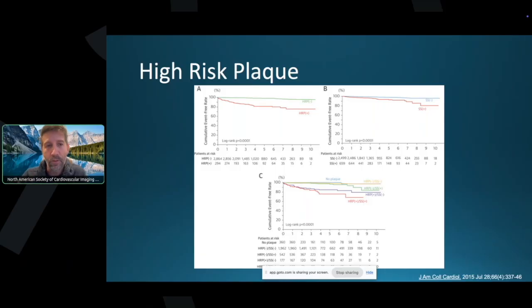So it's important to mention that you have high risk plaque on coronary CTA, or to comment on the coronary arteries in patients that don't get a coronary CTA like this one. This was a thoracic CTA.